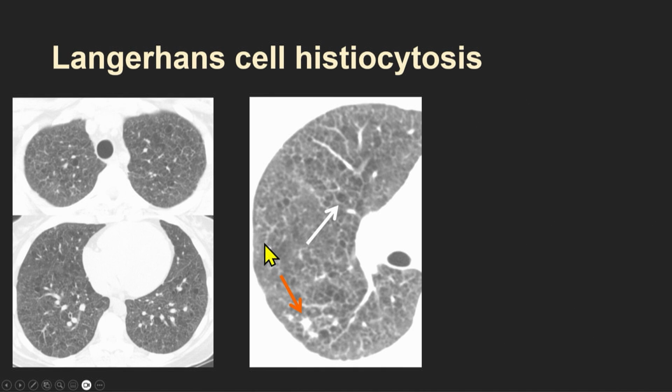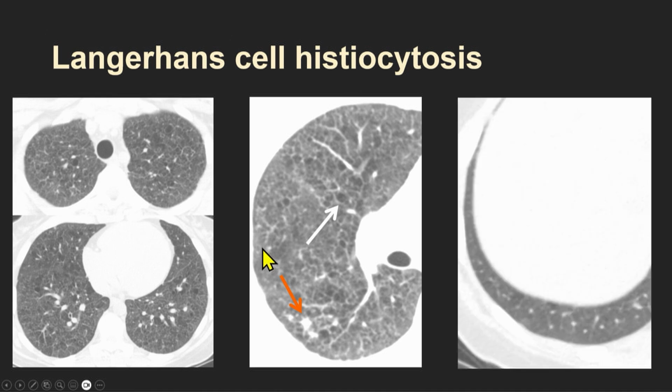I'm sure I missed a bunch of these when I was a resident and fellow because I just wasn't aware of this pattern. But after I learned about this pattern, I said, oh, okay, I saw this before where I was confused. I didn't really know what was going on. But the emphysema plus the interstitial stuff, keep it in your working memory. LCH. Costophrenic angle is spared.